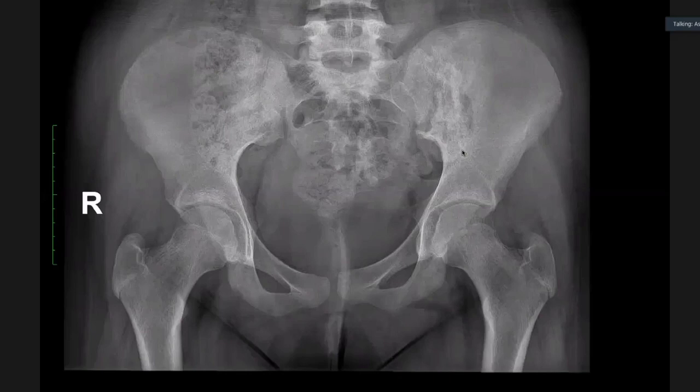Okay. What's happening to the SI joint? Can you see the SI joint there? So there is also some radiolucency involving the left ala of the sacrum. I want you to compare this sacroiliac joint space. So there seems to be some erosion of the left. Erosion, or you can say a bit of widening. Yeah. Okay. Yes, there is widening. Yes. Okay. Right.